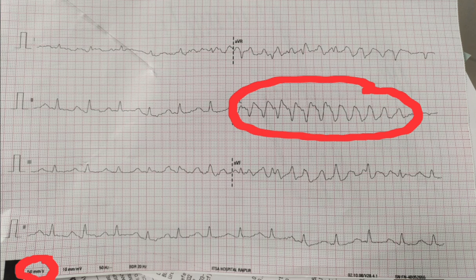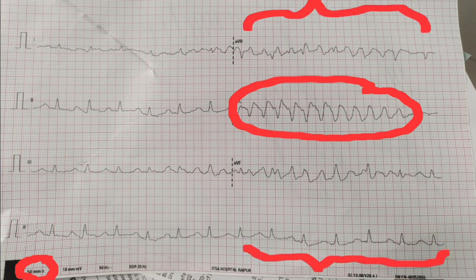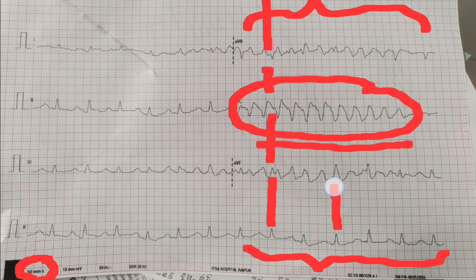Now you see in this same part of the ECG, from here to here, the rhythm strip is showing a normal sinus rhythm. So what is this then? This is artifact. Now if you correlate from one point to another point, you will see that there is a QRS complex which is matching up. So this is an artifact. This is not a VT.